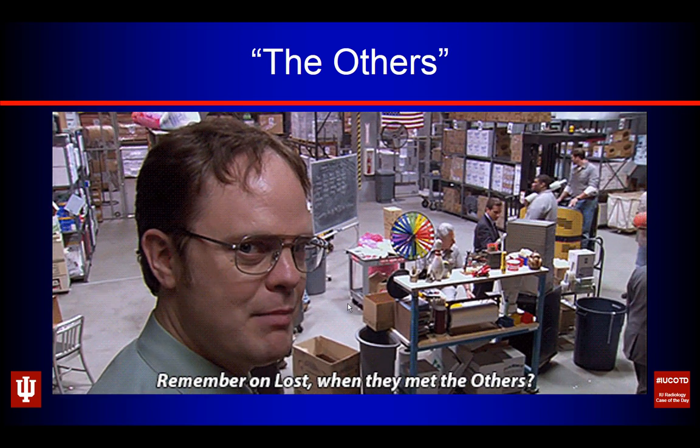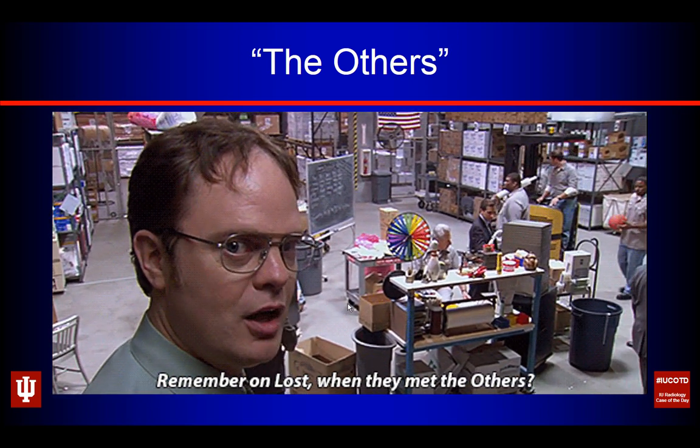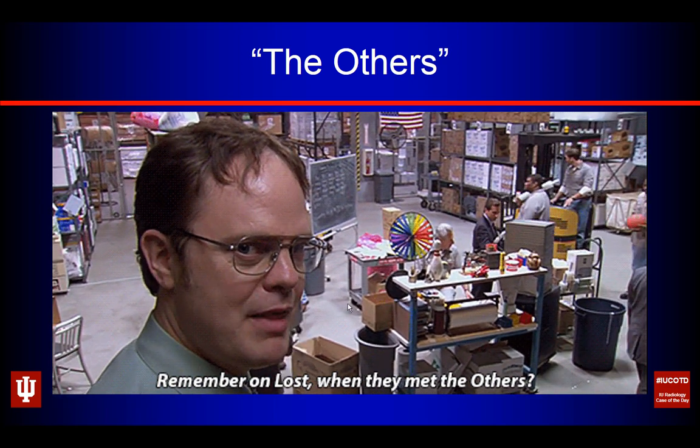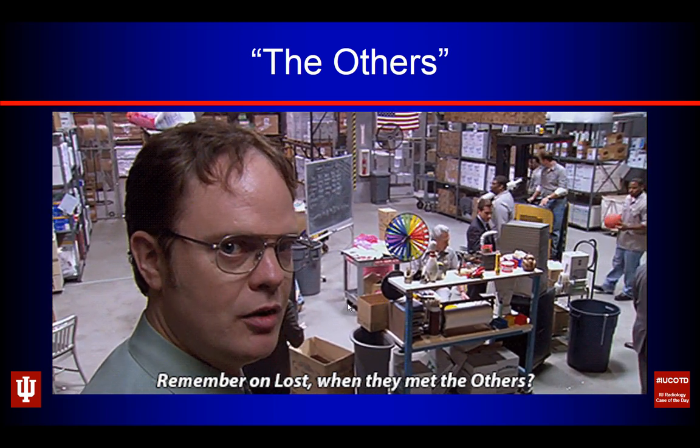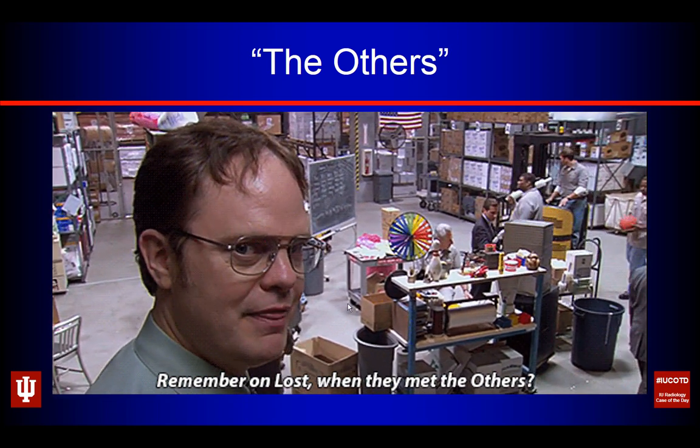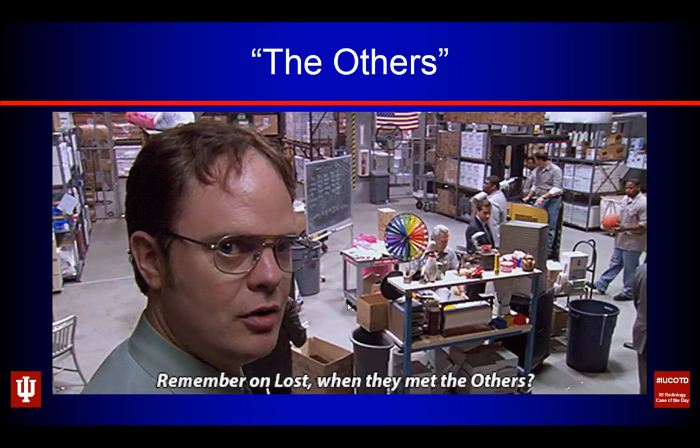So we talked about the main players, but there are others. Okay, do you guys remember Lost when they met the others? So there are others when it comes to parotid tumors, and we're just going to blow through these because frankly, their imaging appearance is all very nonspecific. They all kind of look the same.